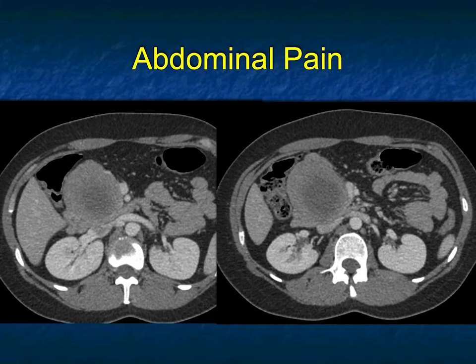It doesn't look like any of the cystic tumors. There are areas of necrosis, but this is not a serous cystadenoma. This is not going to be a mucinous cystic neoplasm or MCN. If this patient was younger, particularly if they were female, you could think about a SPEN tumor. These solid pseudopapillary epithelial neoplasms, or SPEN tumors, have a range of appearances, can be cystic, can be more solid. And although we typically talk about them being female by a 10-to-1 ratio, and usually being in the teenage to 20 years, we've seen them in both male and females up to and into the 70s.